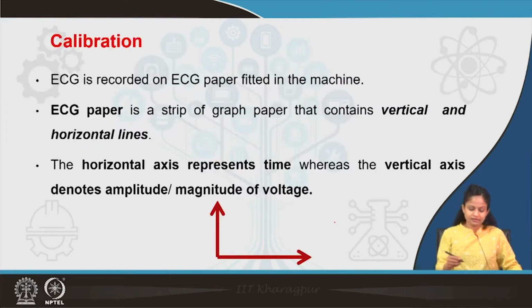Now, this is the slide which had already been discussed, where we covered the calibration of the ECG. This is the x axis, and this is the y axis.